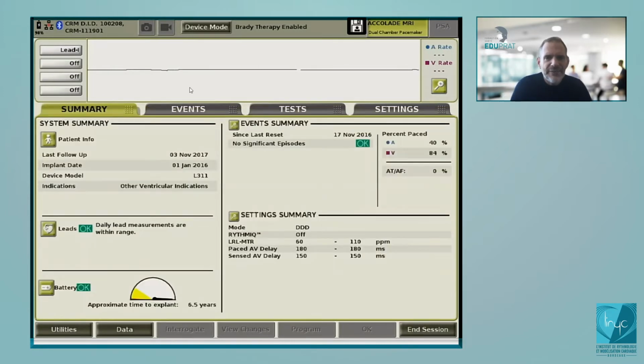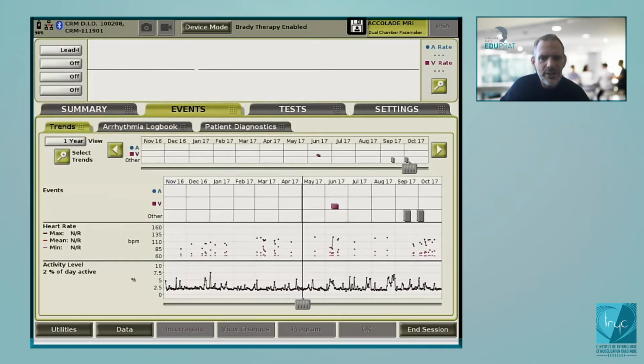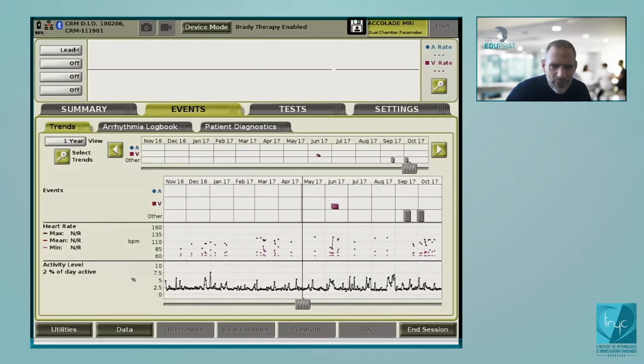Okay, now for the event summary, if you click on it, you need to click to see the events. That's a specificity. Sometimes it's not very intuitive, but if you want to see that, if you click here on top, I don't know, here you see, no. Okay, close. I will not manage to explain it, but whatever. What you see is that you have different pieces of information.